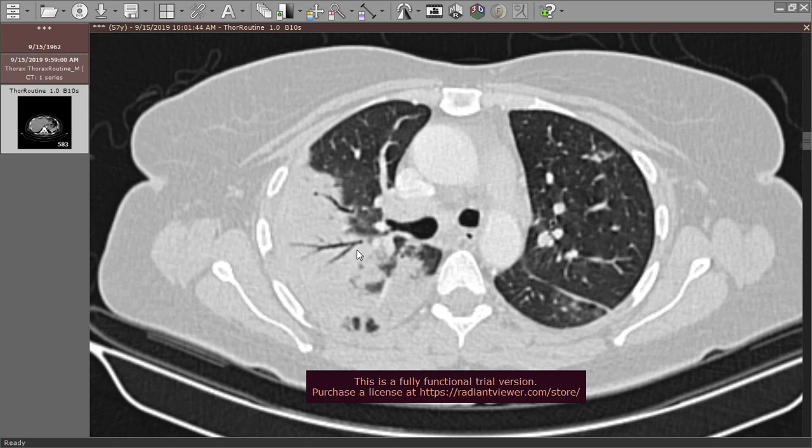Air bronchogram: smooth, non-interrupted internal bronchial tree passing through these consolidative patches without any interruption or stenosis or amputation of its lumen. This means this is an alveolar pathology, not an endobronchial or peribronchial pathology. That's why we consider pneumonia or pneumonic patches as the first consideration or first diagnosis for us.